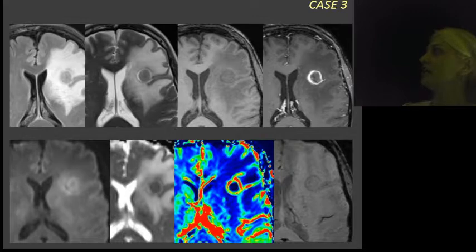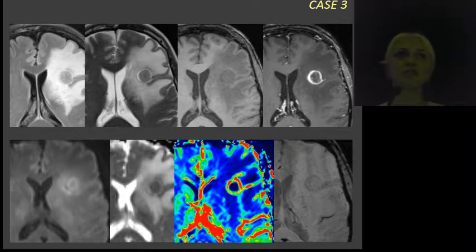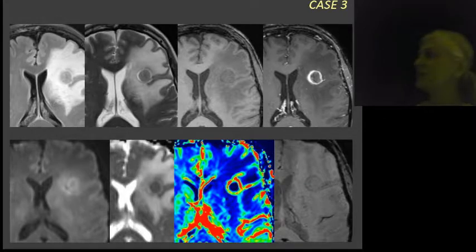Okay, here, I don't know really. Can this be a pyogenic brain abscess? Let's just imagine you don't see this. When somebody asks you, is this bacterial? Then you immediately go back to T2. It's too dark on T2 centrally. That cannot be bacteria. It doesn't look like bacteria, but let's keep on going.